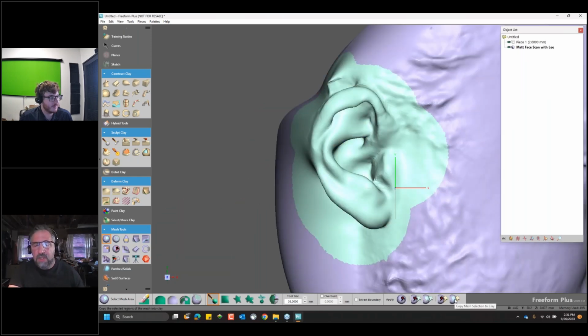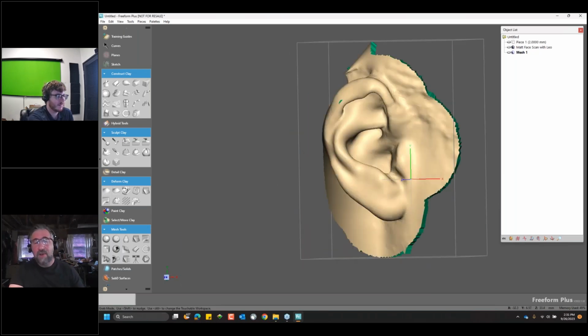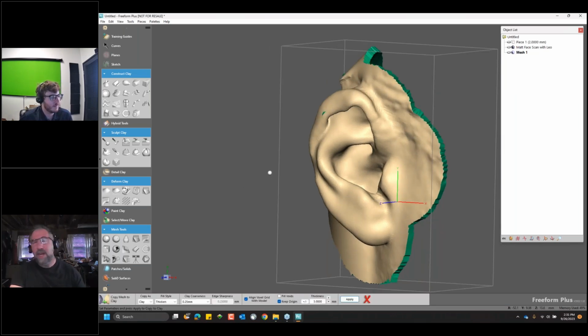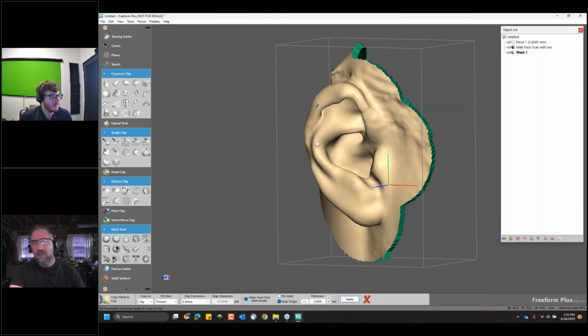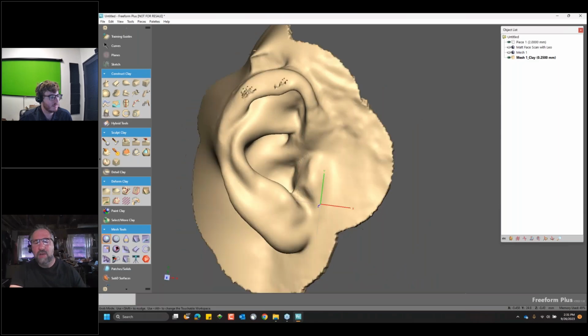Now that we have, 0.5 millimeter was not enough. So thicken, we'll do 3 millimeters, and I want 1/4 millimeter. This will all come into play very soon when we talk about automation, because right now I forgot these steps and the values for what I'm using for converting my data. This is something that happens, especially if you're a designer doing things repeatedly. You can misclick, you can forget, any number of things can go wrong. So I'll click apply, and we have this representation of the ear.